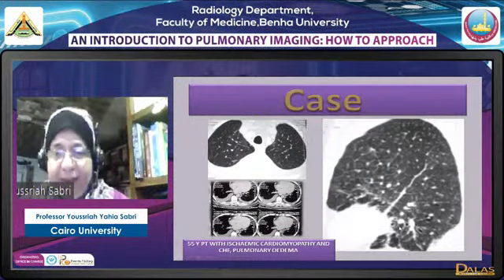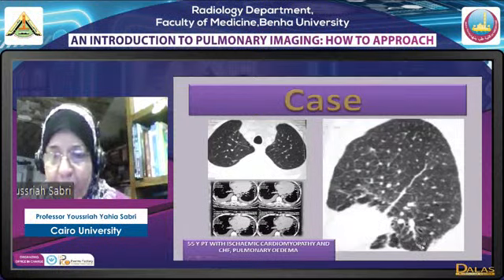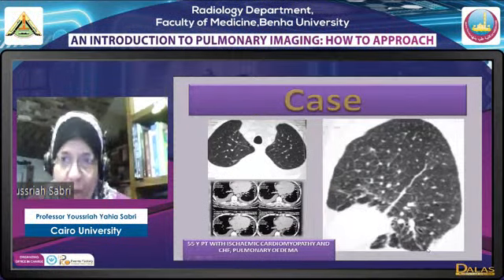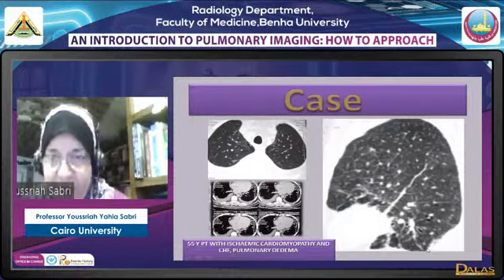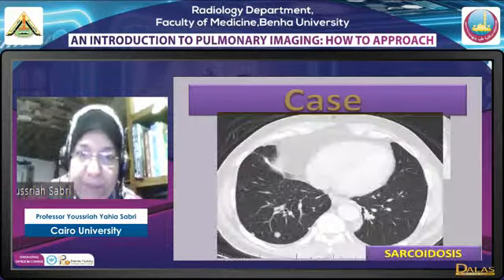And if you look basally in the sagittal image, those linear structures that you see are prominent interlobular septi. So the prominent interlobular septi here are more basal and more posterior because of the physics of fluid. Fluid will be more basal and more posterior. Interlobular septi here are prominent because of water in the interlobular septa due to edema.